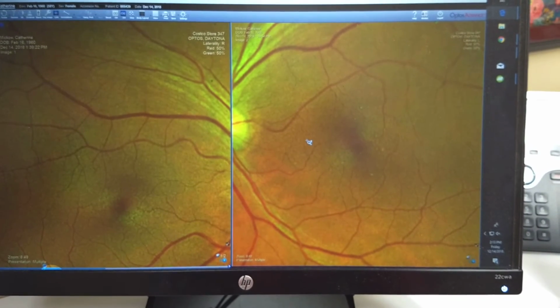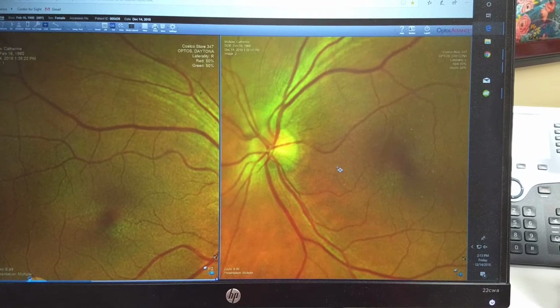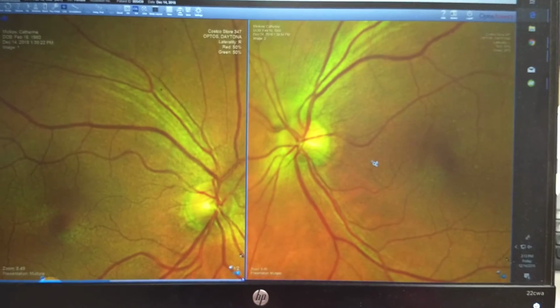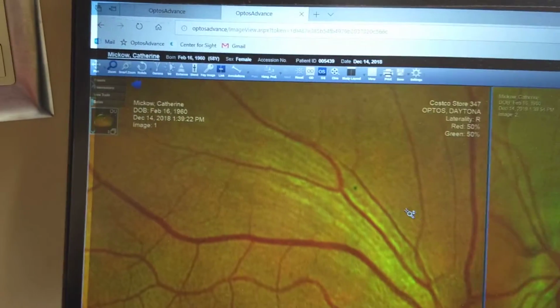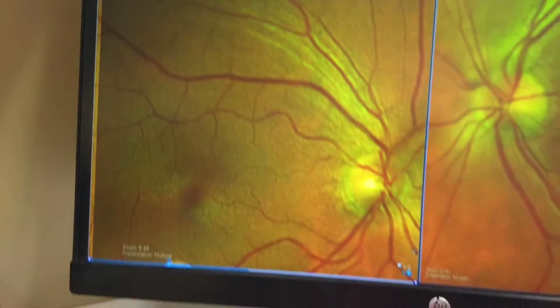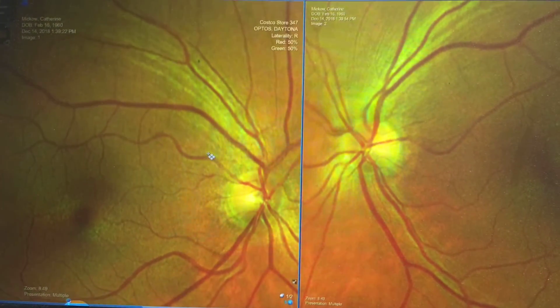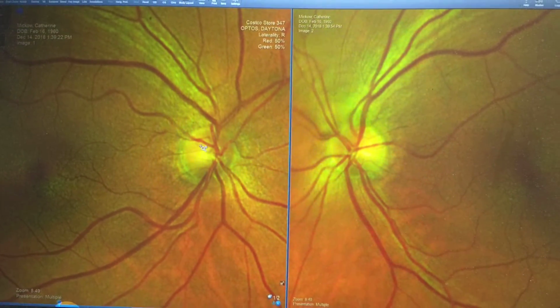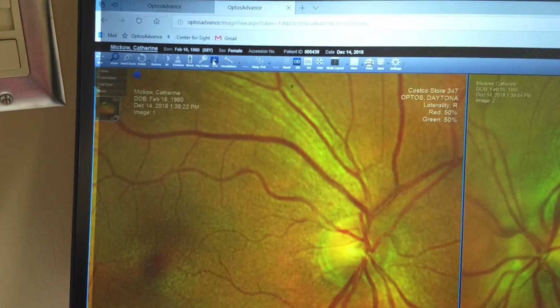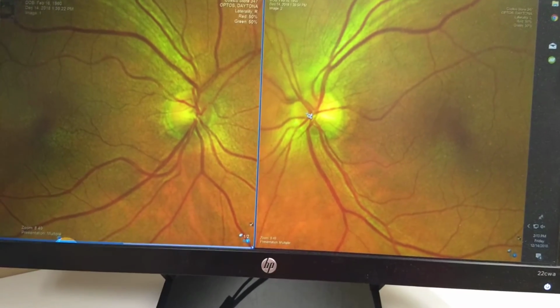And so here is what it looks like. Then you have to right click it and hold it to drag the picture where you want it. Now as you can see, they're off center, and so what I've been doing, this is kind of a pain, I come up here to the link button and I unlink them, put my cursor into this one, right click and drag it up so that it is more equal. And then I go back and I left click the link button again, and now they are linked again, but it looks more like we're used to seeing them.